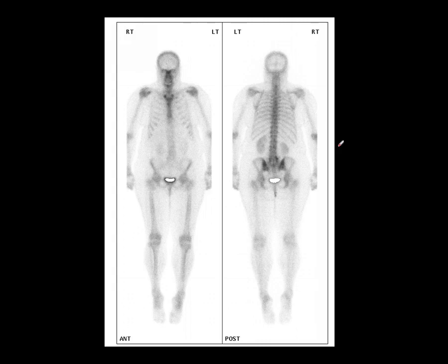A whole body scan has been performed, and you can see there's an area of focal increased activity in the lower right lumbar spine. Now, we've seen in previous videos this could be an osteophyte formation at the disc space margin, degenerative change in a facet joint. We really don't know, there are so many causes, and in order to help us further we need to do SPECT CT.